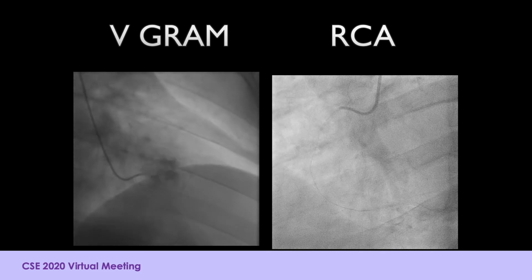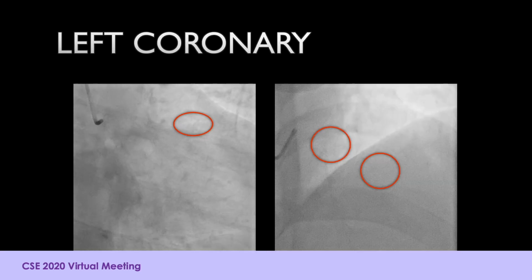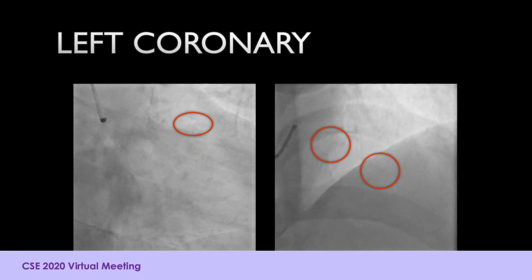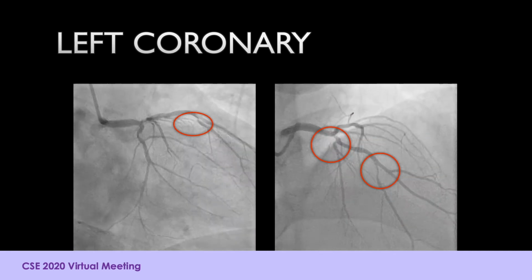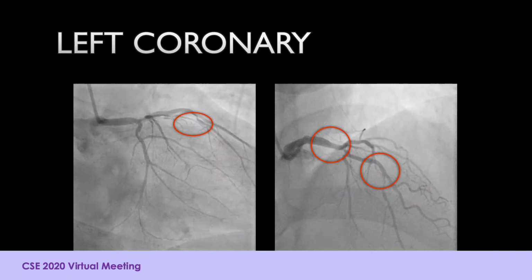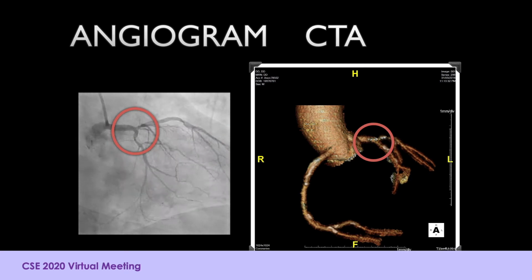This prompted a cardiac catheterization, which showed a normal ejection fraction, a normal right coronary artery, and the LAD did have disease in the proximal and mid portion, in addition to the circumflex having significant disease with an OM branch. He was felt not to be a PCI candidate and hence was referred to cardiac surgery, who wished to operate on him for prognostic purposes. The patient adamantly refused to have coronary bypass grafting and elected to be treated medically. This does highlight how one can get a reasonable correlation between CT angiography and cardiac catheterization.